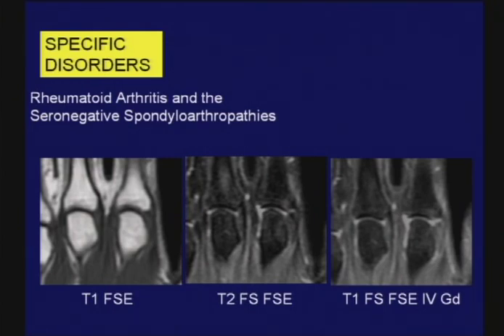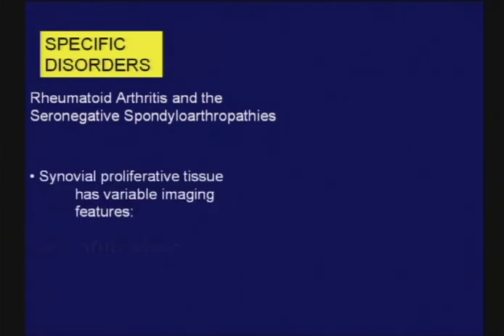I think all this will have to be discussed, because some of the times when we do this, we end up with an incredibly long series of images, many series, I should say, and multiple images that become very difficult to evaluate. So I think changes will occur in the protocols for the assessment of rheumatoid arthritis.